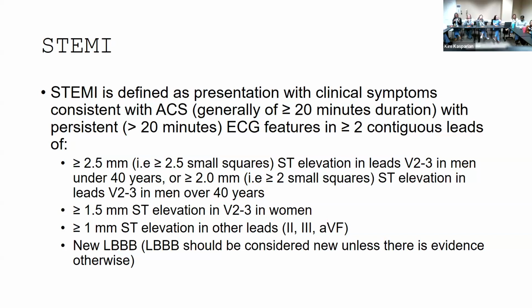Of note, this guy's having chest pain. If they're chest pain free and they have no troponins and they have those findings, it's very unlikely that it's ACS, but still take it seriously.